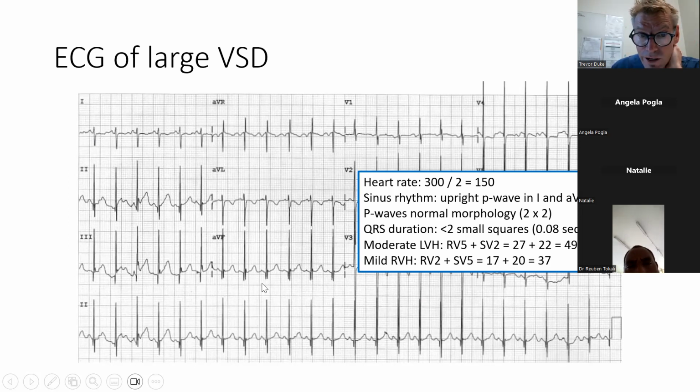Okay, so there's a 3 in the negative direction. For AVF, you've got a deflection down here of only about 3 millimeters, right? And you've got a positive deflection of 5, 10, 15, 20, 21 millimeters. So if you subtract 3 or 4 from 21, then you get, say, 17 in the positive direction, right? So this is important to understand, because when you draw a vector to understand the axis, you need to draw a vector, and I'll just show you that.